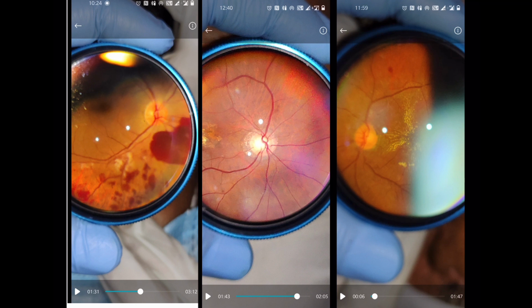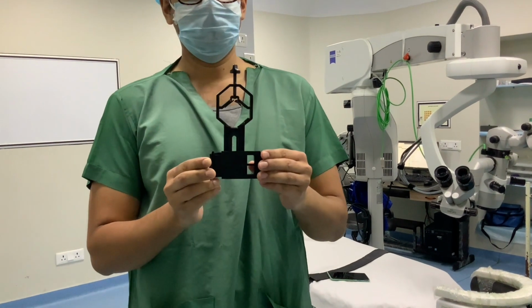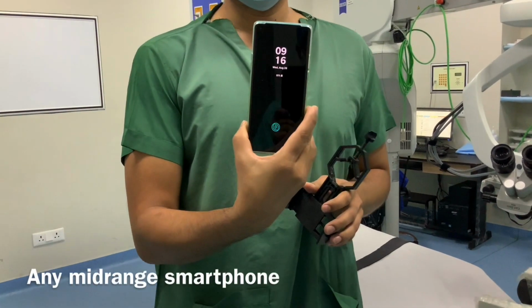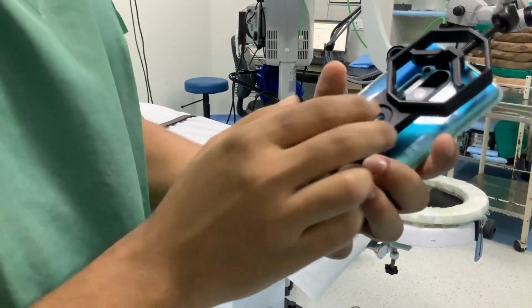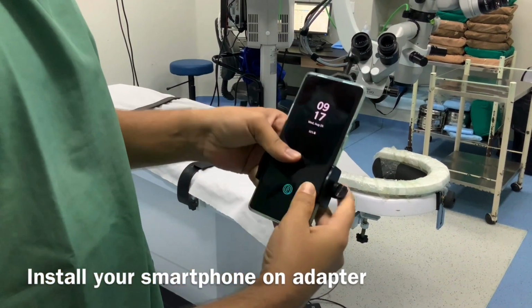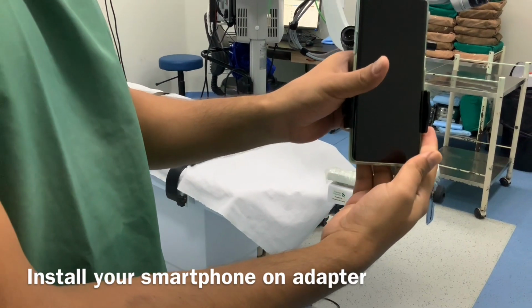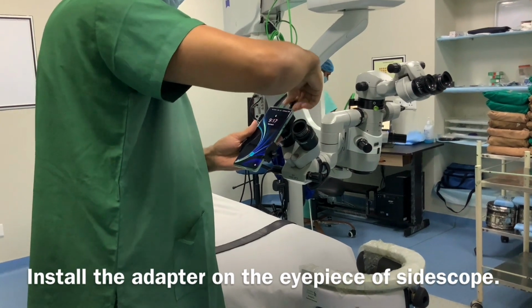Now, the next important use of the smartphone in ophthalmology is in the surgical video recording. This is the way how I do it. This is the smartphone adapter that I'm using. Here is any mid-range smartphone that you can use. You need to install your smartphone on the adapter. Screw it. Now install your adapter on the eyepiece of the side scope.